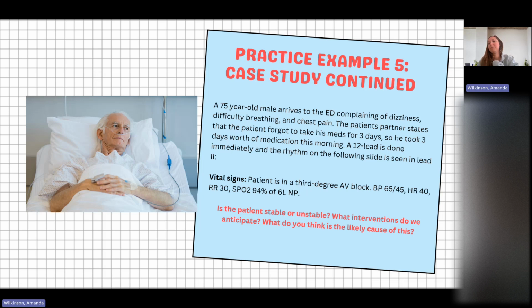PRIs when they have pacemakers. If they're actively firing, I wouldn't do the PRI, but if they're on demand and your patient has an underlying rhythm, then you could do the PRI for those. But I think PRIs, while actively pacing, not super important. I mean, they can, but it's not going to indicate much.